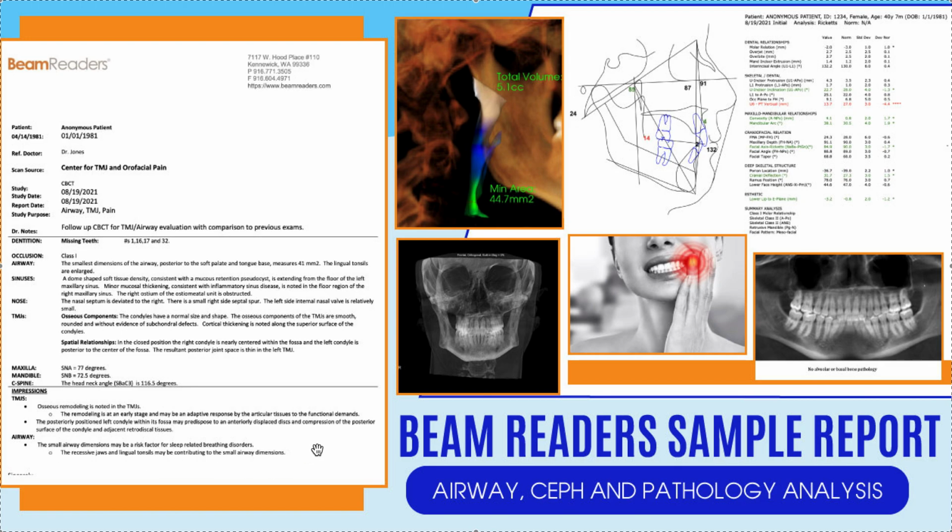If I did this on an ortho patient and if I saw that, then I would be like, okay, whatever mechanics I need to do need to be forward mechanics and not backwards mechanics. If this was a kid, obviously I'd be wanting to grow the jaws, right? Not a kid. Patient is how old? I was thinking it was some type of an adult. And why can I not find the age on here? Oh, 40. So we can't grow jaws.